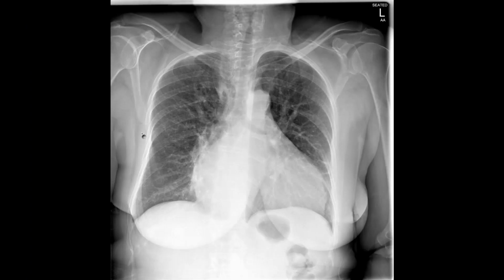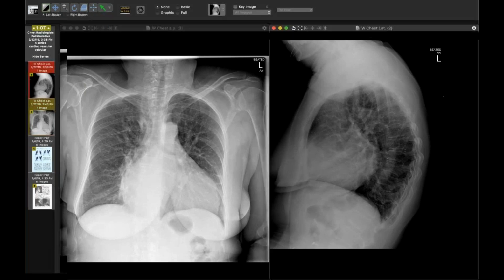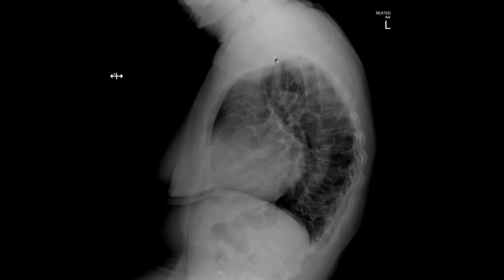It was a huge atrium. Very large left atrium. I'm trying to remember now. Mitral valve disease. Nice example, by the way, of if you imagine barium going through the esophagus, it would go straight down. Then here it would go this way, and then it would come back. So in the old days, we used to do barium esophagography to look for enlargement of left atrium, and this would produce a beautiful esophagram that would go like that, and then come back.